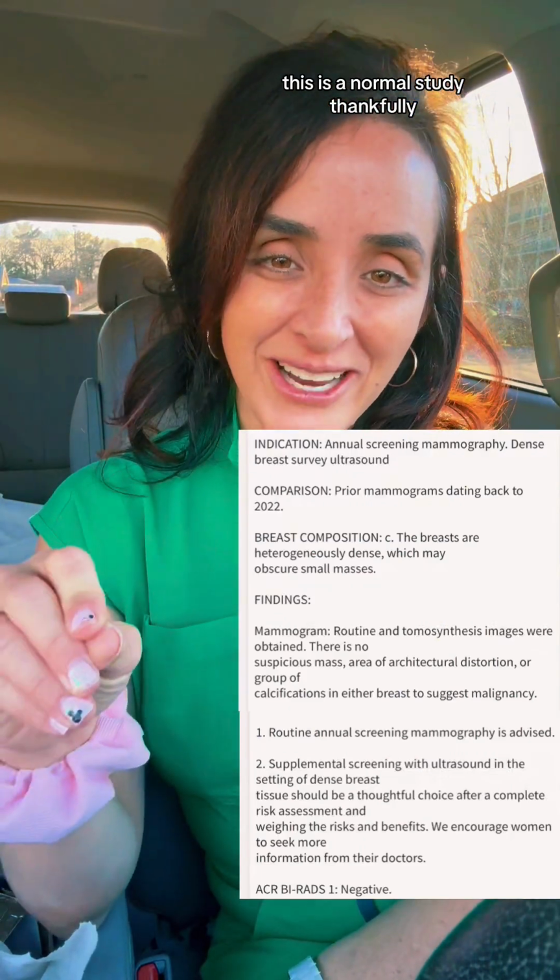I'm an associate professor of radiology specializing in breast and abdominal imaging. So let's get after it, starting with my mammogram. This is a normal study, thankfully.